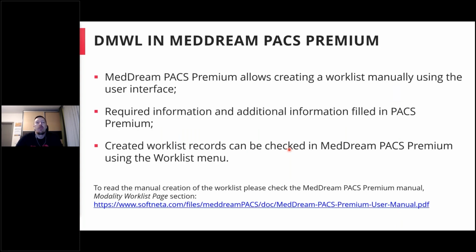So now let's jump to the MedDream PACS Premium, and I will show you the ways how the modality worklist can be created. So basically, there are 3 ways how the worklist can be created in MedDream PACS Premium. We will talk about all these three ways, and we'll try to create the worklist.